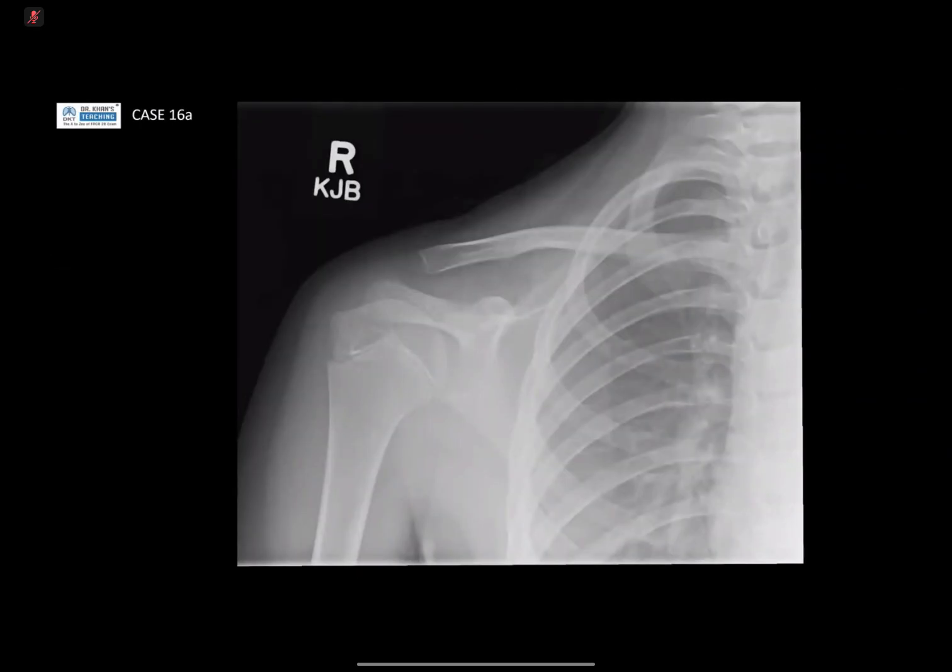Yeah, well done. So going back to the first one, you can see that there's actually expansion of the medial clavicle. You're right, there is no significant bony destruction, but what you have here is periosteal reaction along the medial edge, just underneath here, and possibly along the top. This is smooth periosteal reaction, suggesting a fairly chronic process. Like what Dr. Kapoor said earlier, when you have more aggressive periosteal reaction, the bone has not had time to lay down, so you get partial laying down of bone, and then with destruction, you get Codman's triangle. Imagine the periosteum is trying to lay down, but part of it is not, because it's being eaten away by whatever destructive process. So there's smooth periosteal reaction and bony expansion.